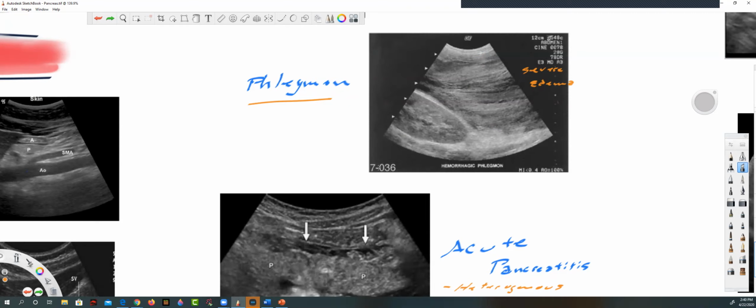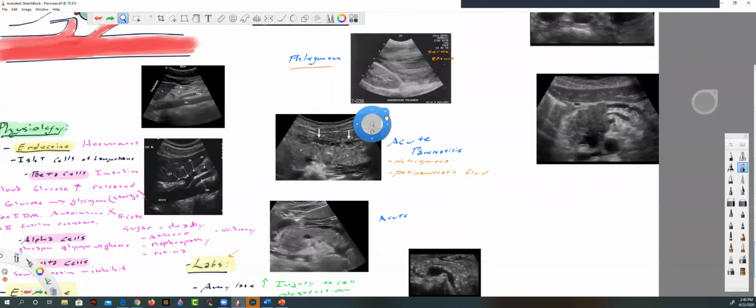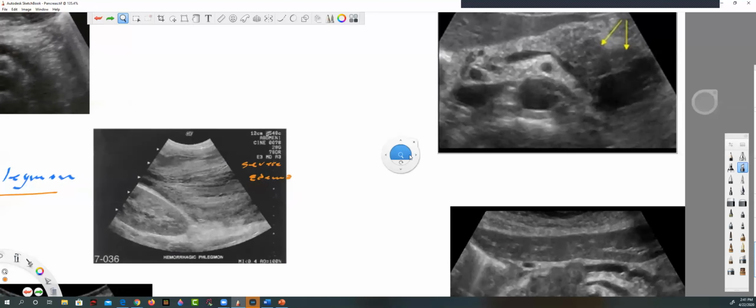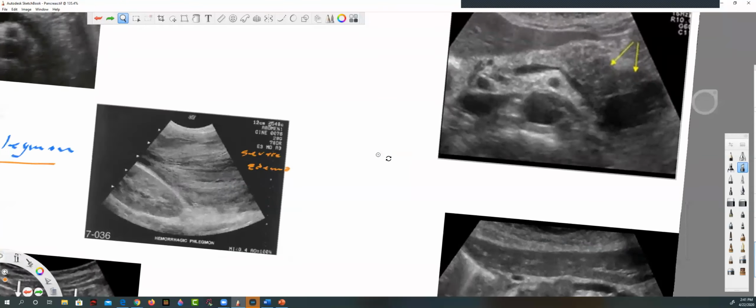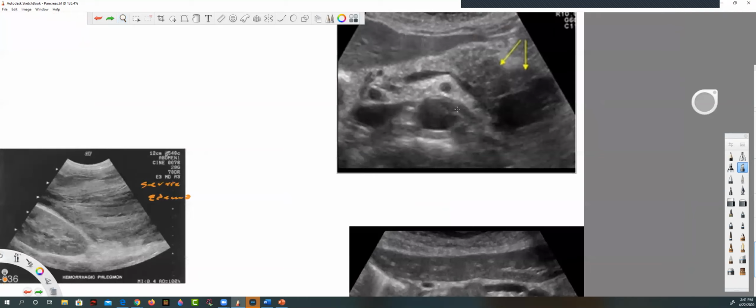Oh, well, right. The other possibilities. So once fluid starts coming out, you know, this is a small amount of fluid. Well, it can be more than a small amount. It could actually be a pretty decent amount. Where did I put? There we are. Okay. I don't like that color. Let's use green, prettier.